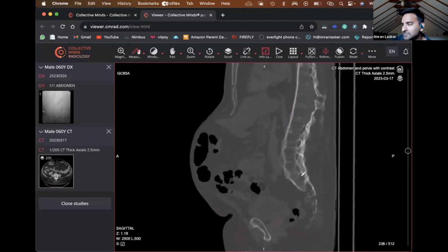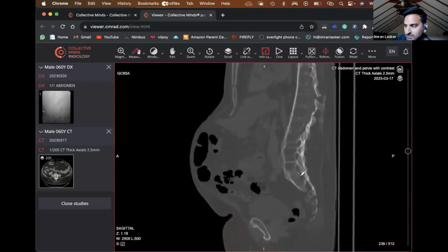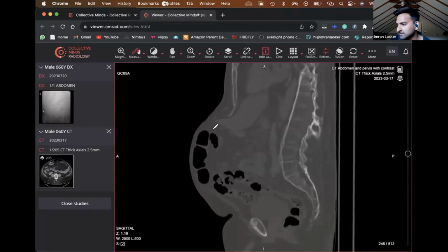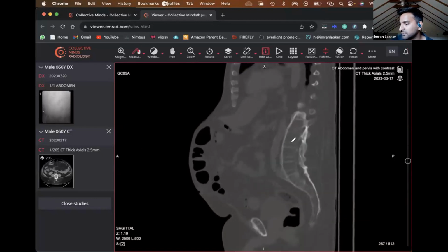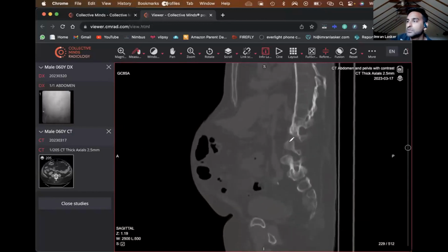Now, one of the things that scares me about ankylosing spondylitis for patients is that any sort of trauma, especially at that stage, can result in fractures, because you get a translation of forces across, and all of a sudden you can end up with a 3-column injury from very, very little. So you've got to be very careful with this kind of thing. Make sure you've had a good look at the bones, because once we had a patient who came in and had a CT scan for something completely unrelated, and there was a fracture there, and they came in later and it had slightly moved because it was unstable. So if you have someone with potential ankylosing spondylitis, do have a look.